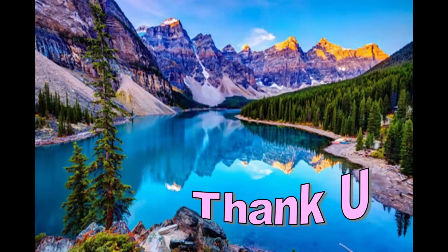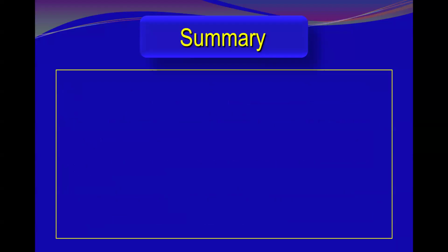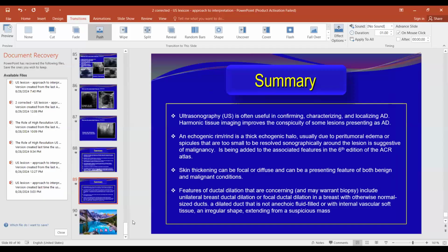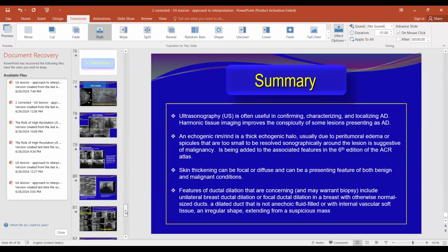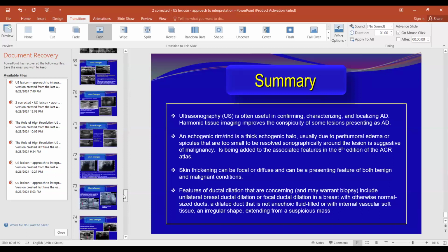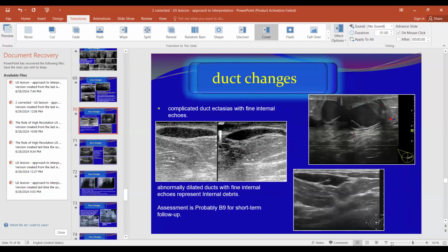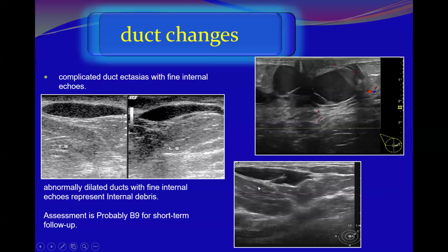And I have even shown you one of the cases. Let me show it to you again. Yes, this one. Here, this is a single duct, transverse and longitudinal. And this is also a single duct, okay?